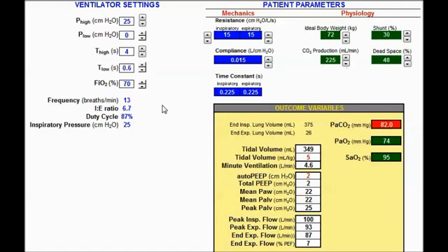I do not have an expiratory flow waveform to evaluate now, but I know based on my time constant, based on my compliance, I'm going to start out my compliance as a typical ARDS patient with 15. And as you can see, this creates an expiratory time constant of 0.225. So if I set my T low exactly at this, it would approximately get me in that 50 to 75% range. So let's go ahead and do that.